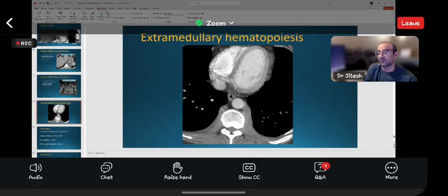One factor which favors malignancy is invasion. It invades the airways, can cause occlusion of the airways, and can invade adjacent structures. The patient may present with atelectasis, blockage, or SVC syndrome. Those are the findings which favor malignancy.